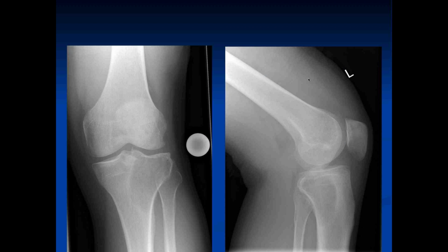Okay, so let's carry on with giant cell tumors. Michael, what do you think of this?